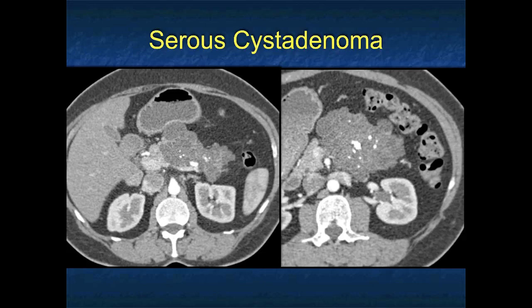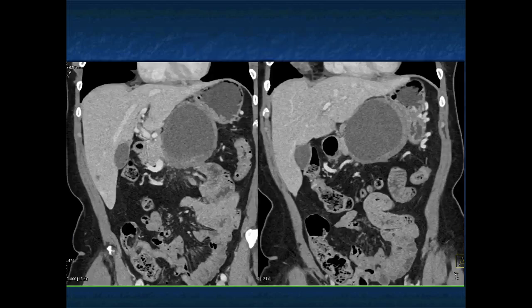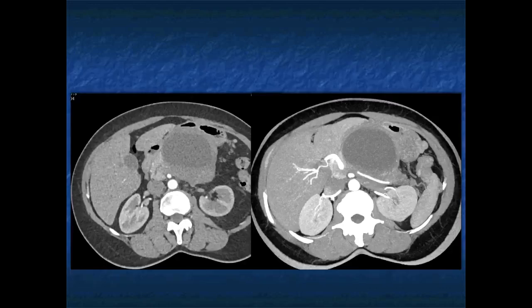So I showed you two serous cystadenomas. It's amazing the different appearances of serous cystadenomas. It's really a chameleon. Another case, cystic lesion, body of pancreas. Compared to the last case, it's better defined. I don't see calcifications, but I do see a thickened wall.